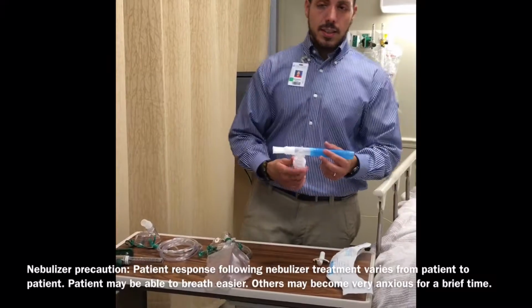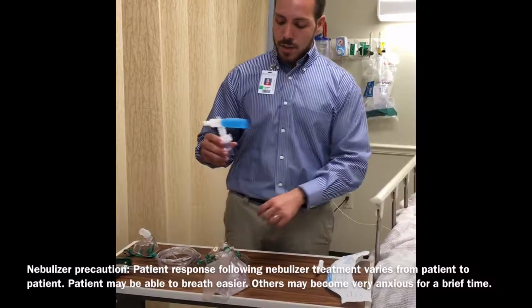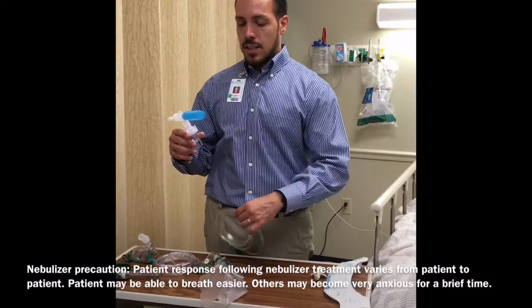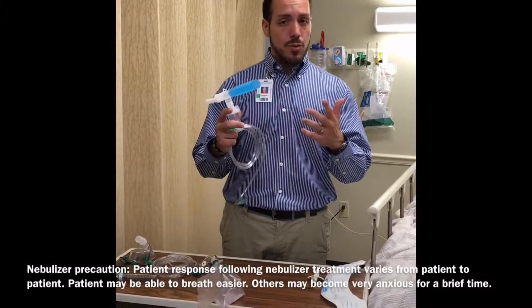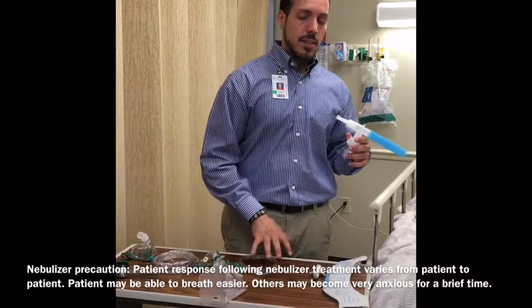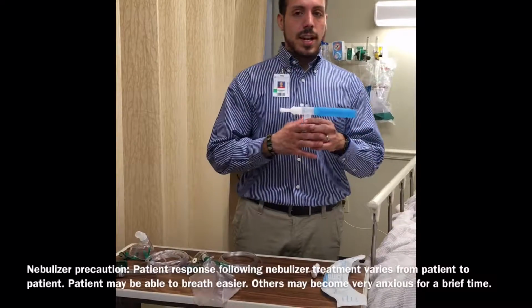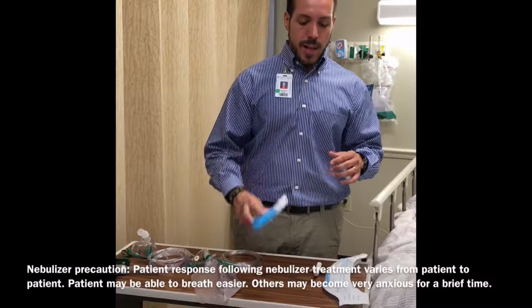This next device is for a nebulizer. Obviously, you would have a nebulizer machine itself hooked up with one of these lines, and typically they'll have a medicine inside, typically albuterol, and they're going to be having a nebulizer treatment, a lot of times inside their bed. So with these, you just want to wait till they're finished, and then you can ambulate after.